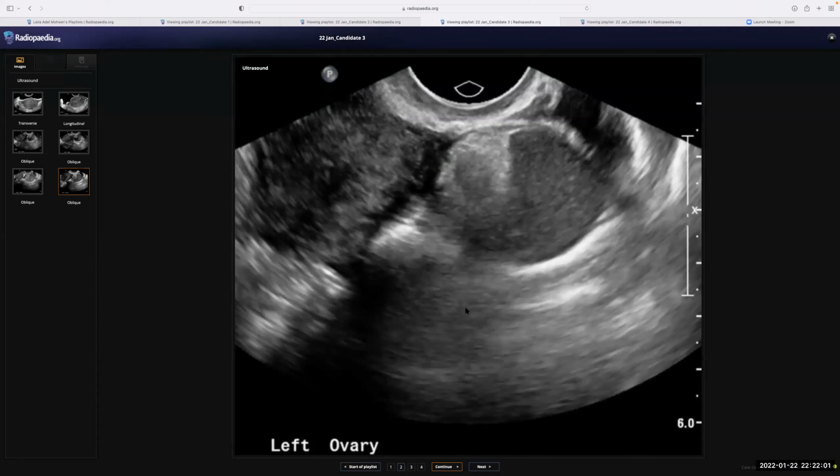Well, again, it's the left ovary. In the left ovary, there is a difference in the echogenicity within the mass. Some are hypo and the others are hyper. So this gives the impression of the possibility of infarct within the ovary. Any other possibility? It could be an abscess also within the adnexal region. I'm thinking of two emergency things: tubo-ovarian abscess or torsion. This causes acute pain in the abdomen in young females.